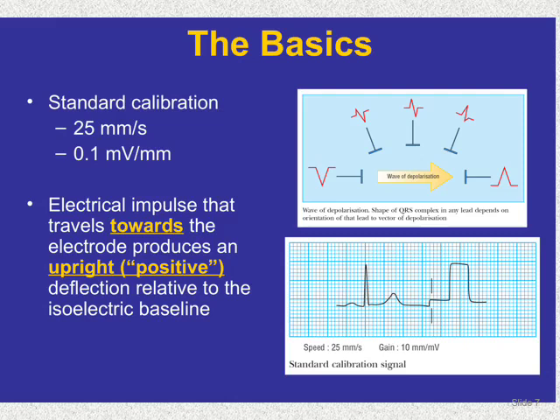Each small square will be 40 millisecond or 0.04 of a second. As regards the voltage, the standard calibration is 10 millimeter equals 1 millivolt.